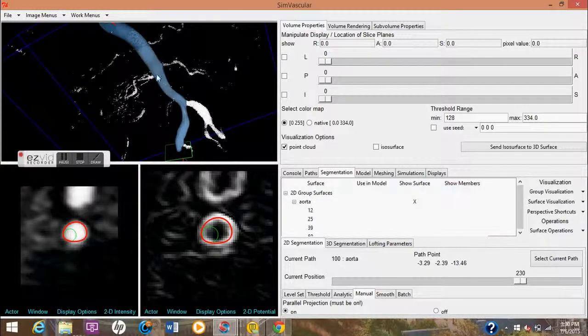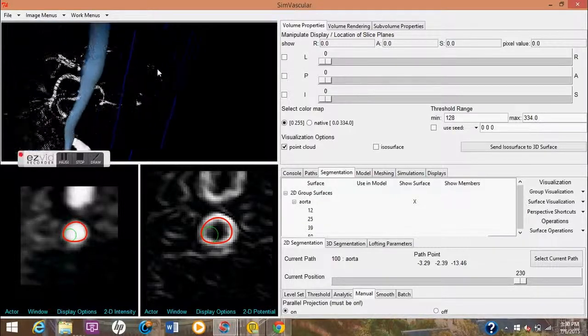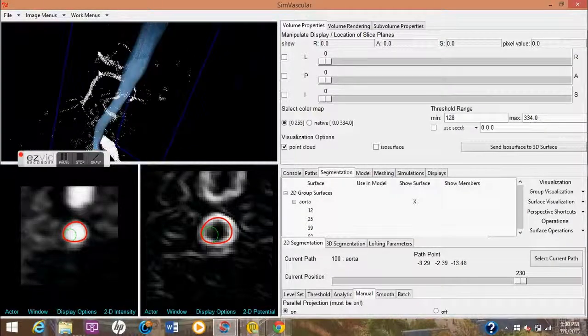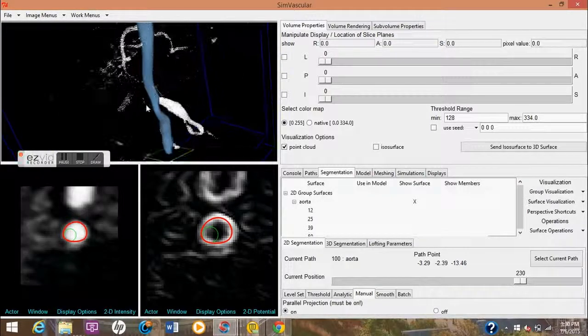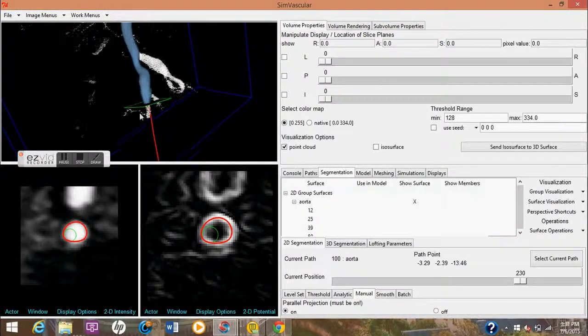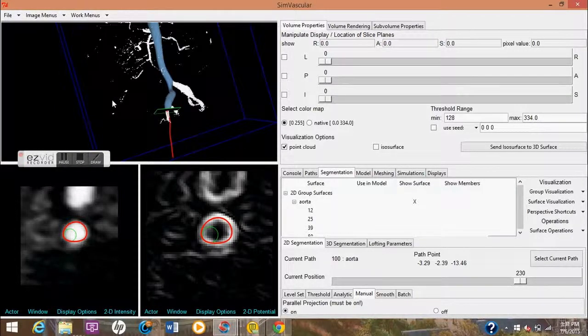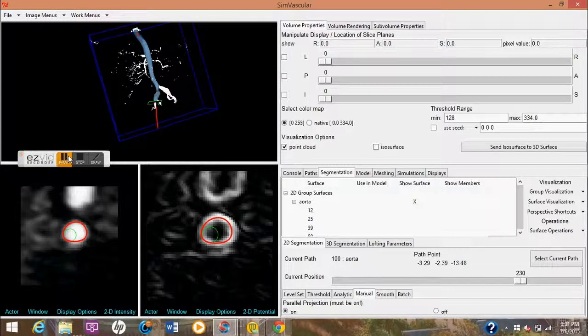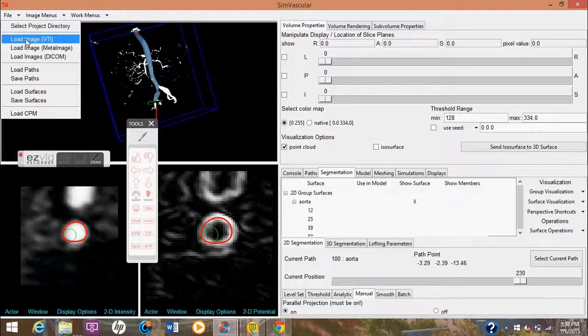It's not perfect, but for the part of the aorta we were pursuing, and then going down the left side, which is what I was going for there, pretty good. I didn't get the final pieces there. It gets a little trickier at the end, but that's a pretty good outline. And so you can check that via point cloud.